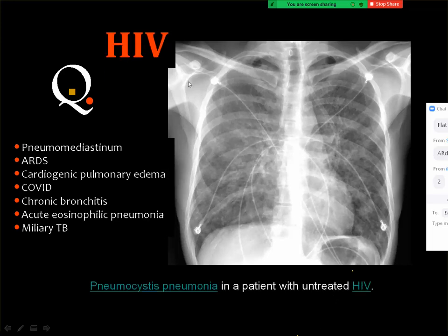And this patient is known to be HIV positive. Then the answer will be, why not COVID? The answer will be this type of pneumonia, pneumocystis pneumonia.